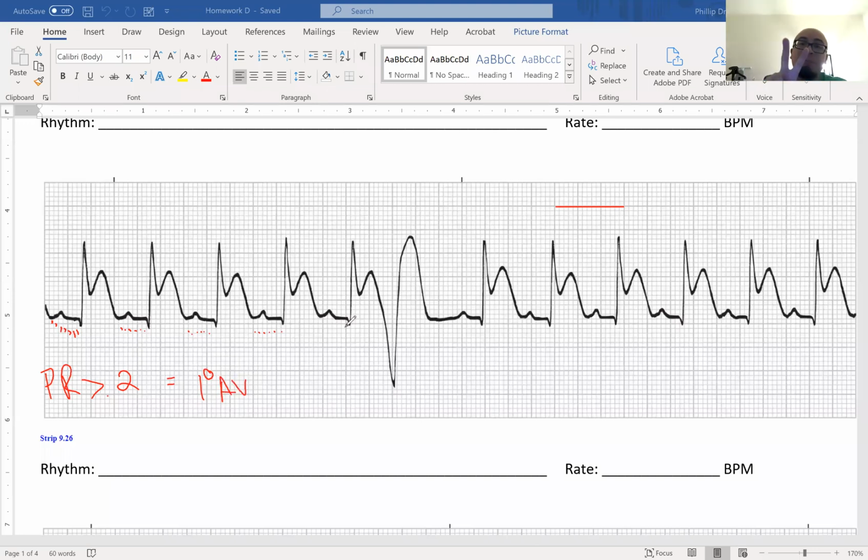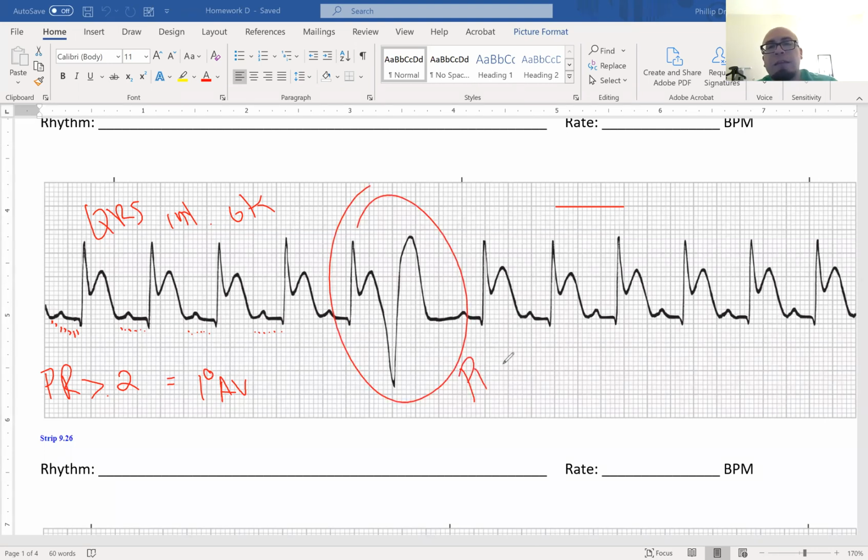All right, so we're still on step number 2. I'm sorry, step number 3. We've checked our waves, they're all there. Now we're on step 3, checking our intervals. QRS interval is okay, within range. Now this is just part of the interpretation. It's not the rhythm. So what's the rhythm? Well, we're gonna get to that. Right now we're on step number 4, abnormal beats, and we have one big abnormal beat there, which we know is a PVC because it is a wide QRS, wide and bizarre.